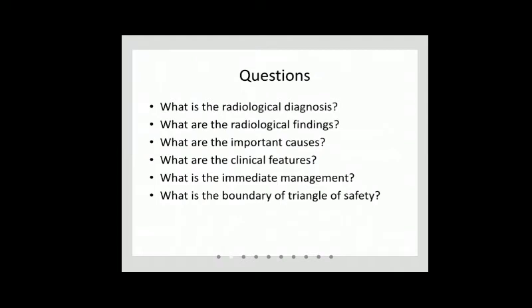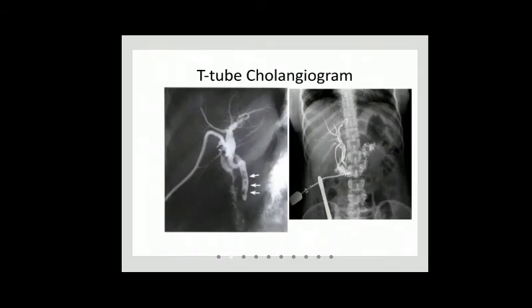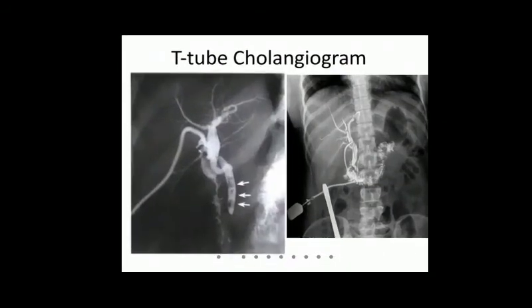So our next topic. What have we seen in this X-ray film?